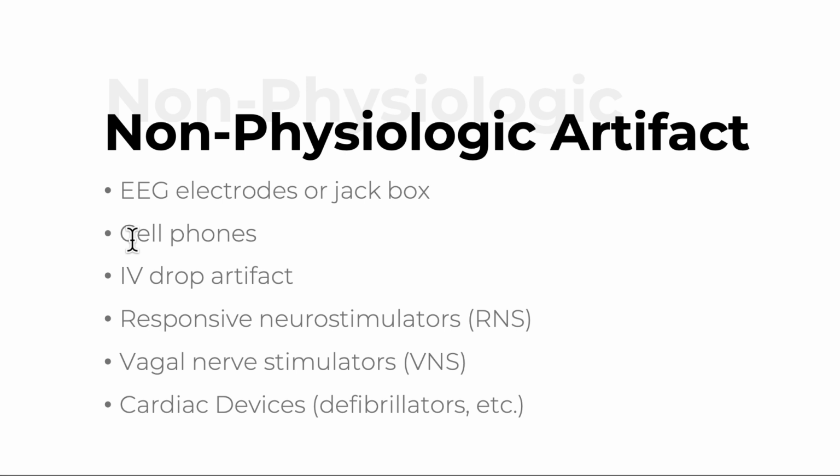You can have devices cause artifact, IV drips, which technically some of that is not electrical. It's the actual movement of the electrical field of the water. So anything that is external to the body that's not physiologic of the body is considered external, like non-physiologic artifact.